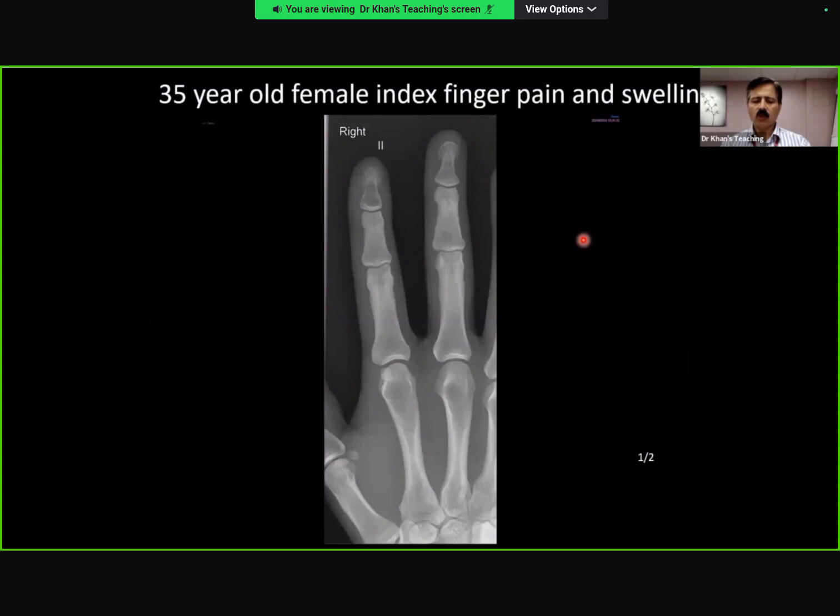Candidate 2, over to you. This is a frontal radiograph of the right index finger of a 35-year-old female patient. There is an abnormality of the right index distal phalanx, where essentially the entire medullary cavity is occupied by a lytic lesion without particular evidence of expansion or cortical destruction, but there is a transverse lucency through the proximal aspect, suggesting a fracture through this.